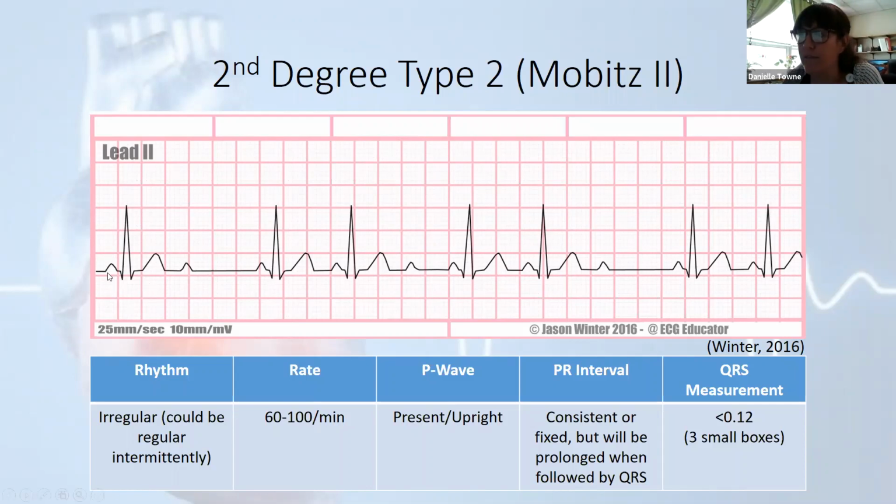Right, so we've got a P wave, and this PR interval actually looks pretty good, right? Normal. So P wave, QRS complex. P wave, nothing happened. Impulse was totally blocked by the AV node. Never got sent down. But this next P wave, he just chugged on again. Oh, there's a complex. P wave, complex, P wave, no complex. P wave, complex, P wave, complex, P wave, no complex.